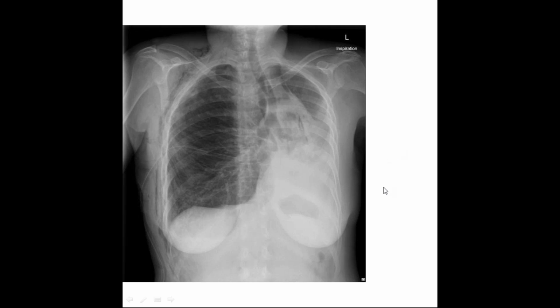Okay, describe the X-ray. Good. Trachea is deviated to left. Yes. Pull to left. Apart from that, whole mediastinum has shifted to left. Yes. Is it only shifted to left? Has it gone up as well?